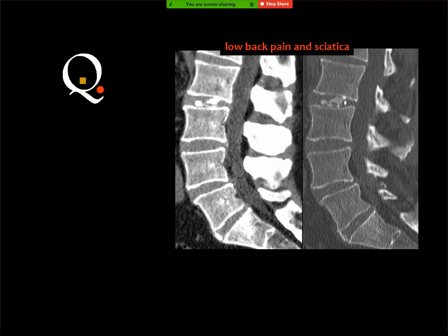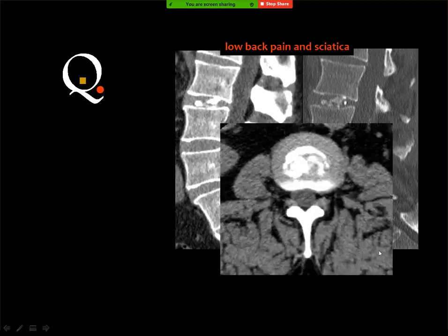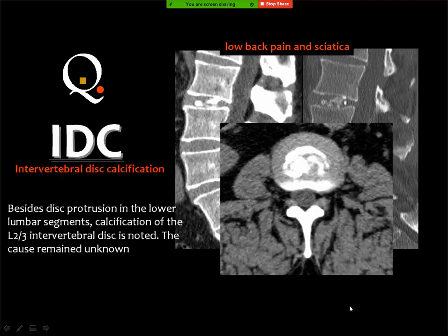Calcification, intra-articular. Yes. Disc replacement. Disc space cage? No. This is just calcification within the disc. There is no surgery, and this is just calcium within the disc itself.